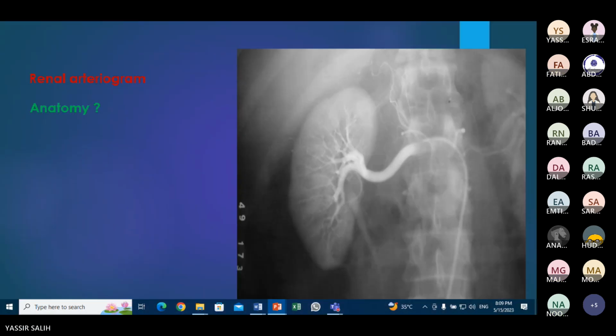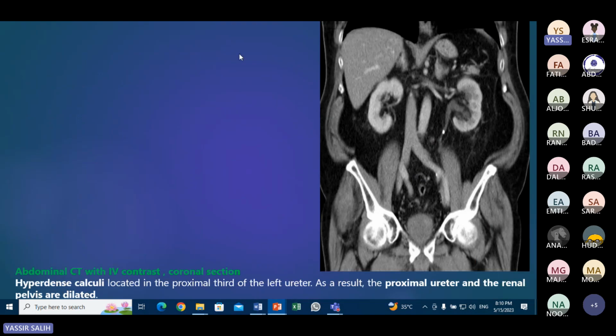Osteomyelitis. Next, this is a renal angiogram; we covered almost all of this in the same way. A catheter is introduced into the renal artery, so this is a renal arteriogram. This is the renal artery, this is a kidney, and this is the catheter. What is this image?